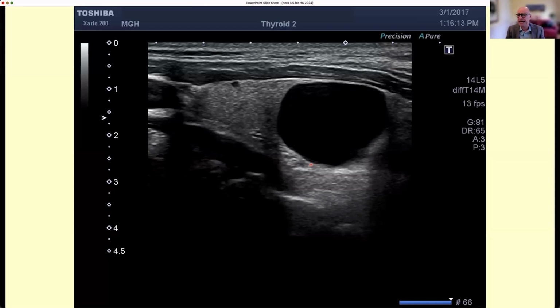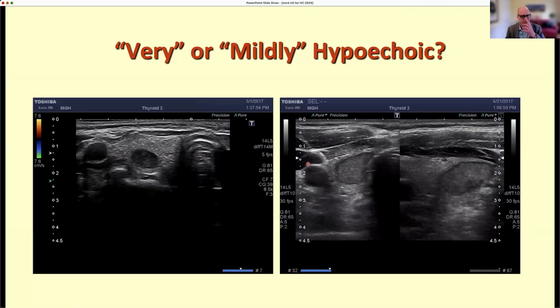And it's seen behind a cystic structure, but not only. You can see posterior enhancement behind solid structures that are compact enough to have a lot of through transmission, a lot of echoes going through them. So posterior enhancement is not proof of a cystic nature, but it's important to recognize it for other reasons.